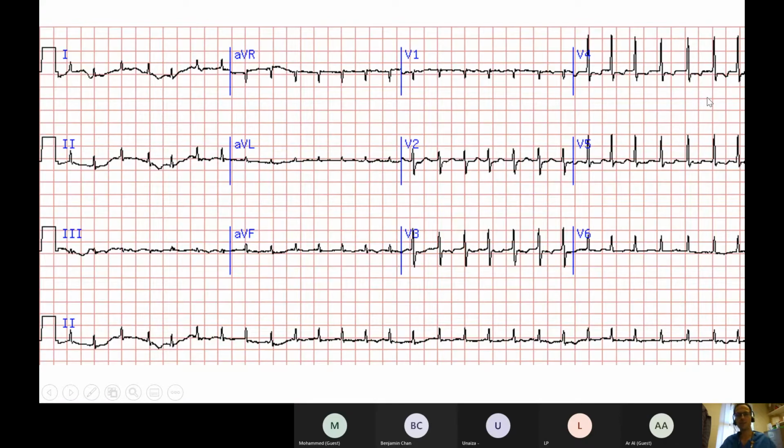What about this ECG? Apologies that it's not as good a quality ECG. I must update it to a better one, but this addresses the point that I'm wanting you to pick out. So what do you think the heart rhythm is here in this tachycardic ECG?